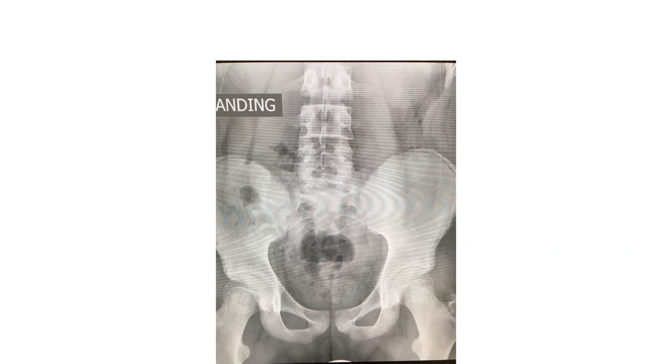So what do you think that radiolucent, that dark area is? It's cartilage, the growth plate, okay? That is an apophysis. Did you come across that when you're reading anatomy? You remember what apophysis is? It's where muscles attach. It's where bones get bigger and grow out. So your tibial tubercle, your greater trochanter, your lesser trochanter, your olecranon, they're all apophyses. And that growth plate will fuse and disappear when this is a fully grown patient, okay?